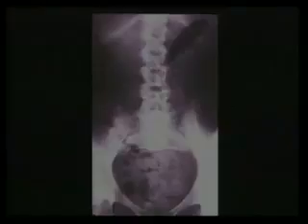Do you guys notice anything on this? Yeah, pelvic pressure. No pelvic fracture. Where do you see a pelvic fracture? Oh, never mind, it's just the wing, sorry. No bottom of the sacrum. This is partial sacral agenesis.